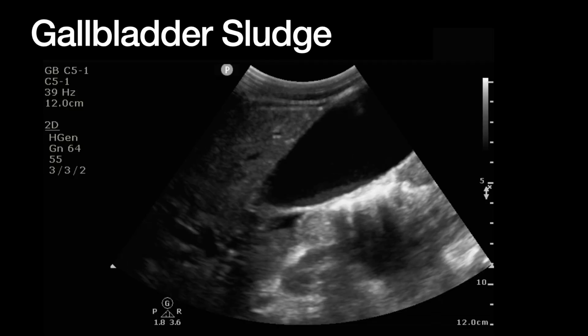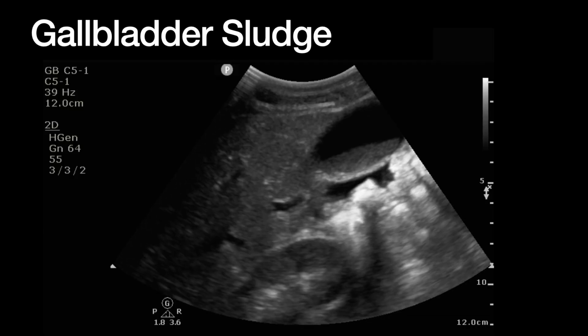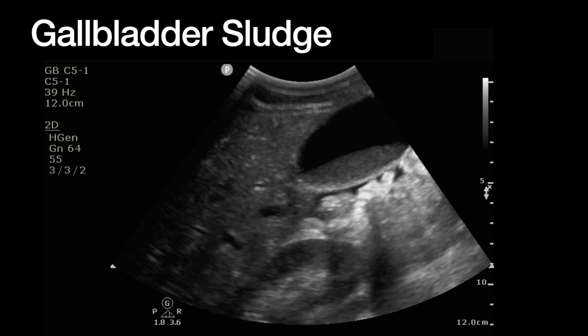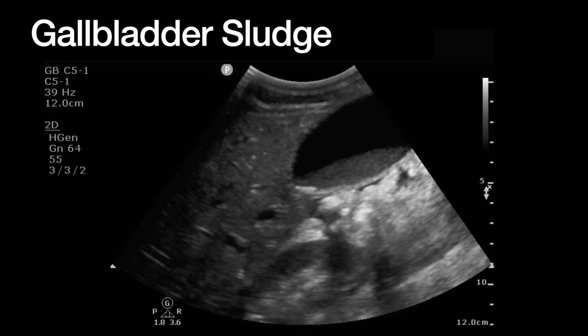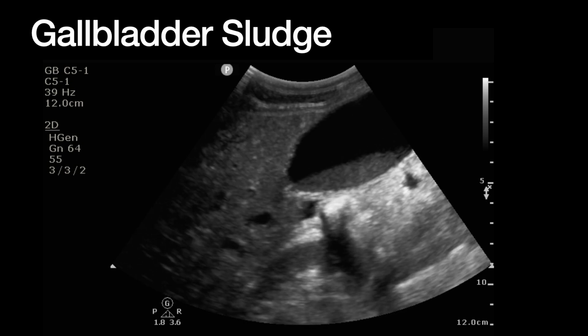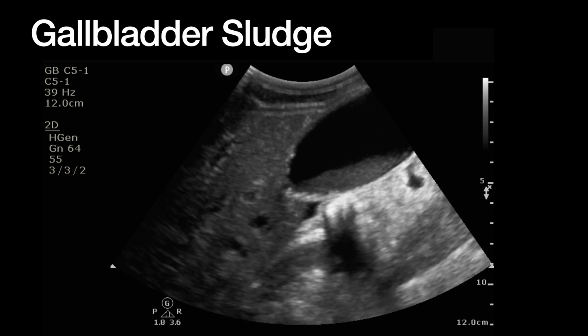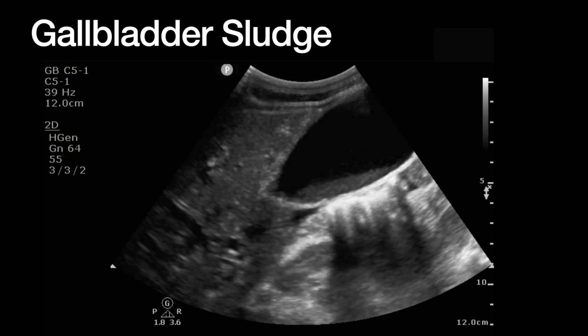The second thing is gallbladder sludge. This is very commonly seen. It's technically not gallstones. But gallbladder sludge, according to one of the sources that I was reading, is this thick stuff. You can see it here layering out in the posterior portion of the gallbladder, made up of different mucins and glycoproteins and calcium and different pigments.